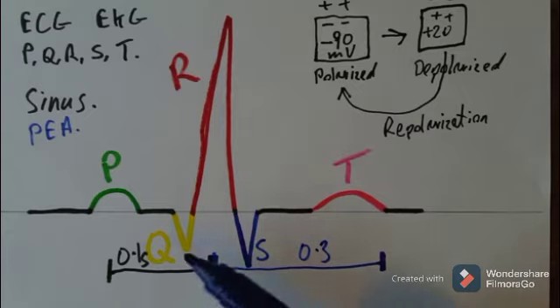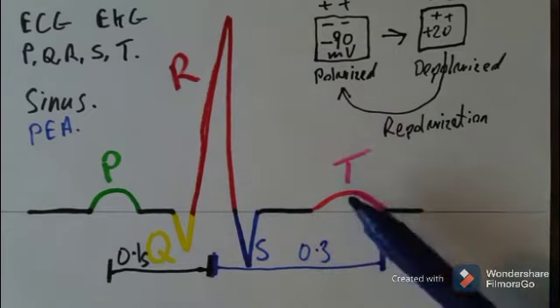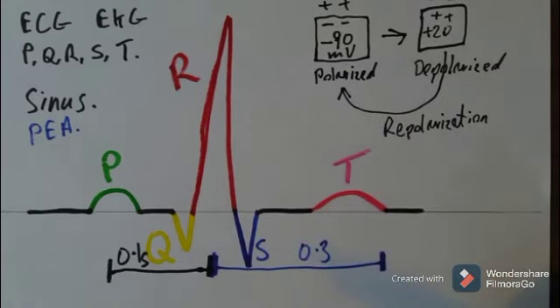Now, with practice, these ECG readings can tell us all sorts of things. We can do positional ones called 12-lead ECGs. They'll tell us about the normal conducting pathways. They'll tell us about heart damage. They'll tell us if the heart is enlarged. And they can also tell us what's causing myocardial pain. So well worth learning the basic PQRST. And then with experience, you'll realise that this has lots of implications for pathology, patient assessment, and patient management.